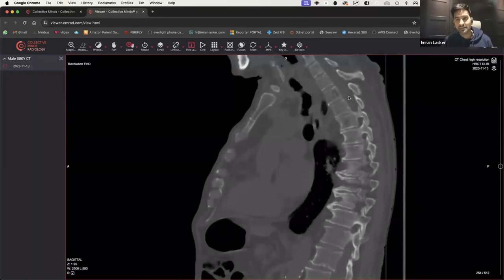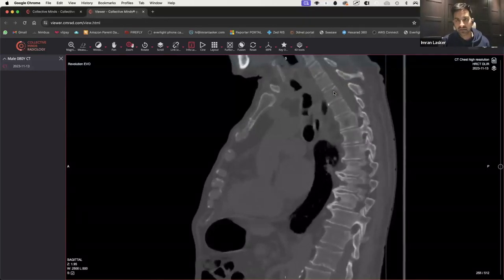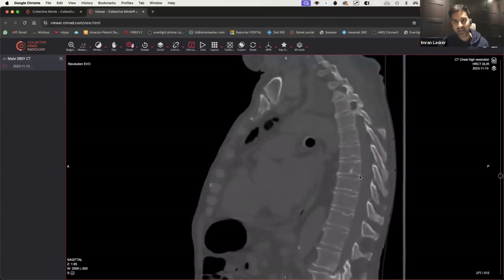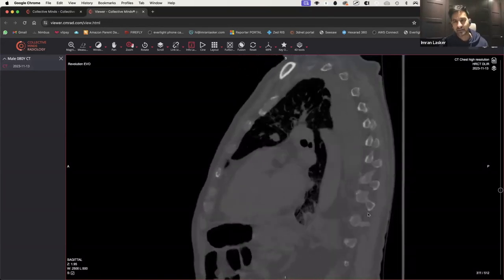That's a good point. So some people may worry that this over here could be a focal metastatic lesion. But when you look at it, they look kind of linear and very straw-like. And when you've got straw-like fatty areas, it's probably going to be a hemangioma. Exactly right. And then you've just got to still look there. You've got to really look. So again, that could be hemangioma. It looks very linear and hypodense.